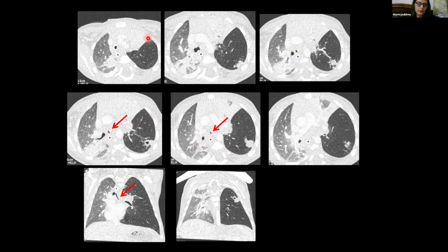So the lung window also showing this, confirming this airway narrowing here. And there is collapse of the left upper lobe, and there is hyperinflation of the left lower lobe. So those of you who noticed, or I'll repeat it here, congenital lobar overinflation usually will not involve the lower lobes. So involvement of lower lobes is quite uncommon. In addition, we are getting findings in the lung. So what are we seeing here?